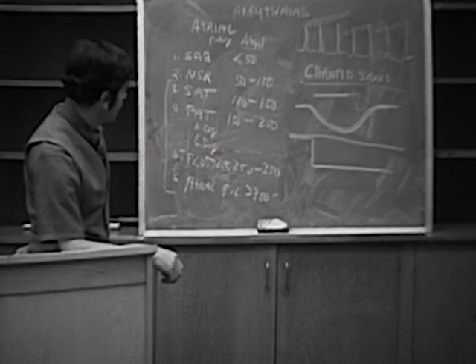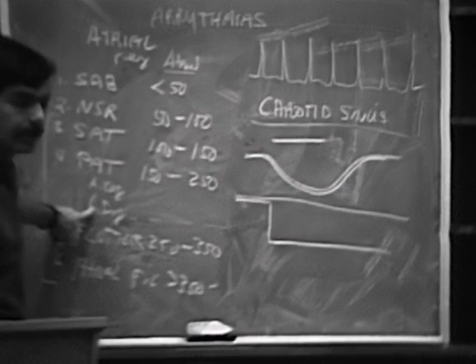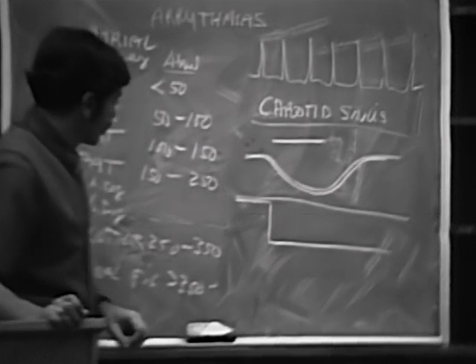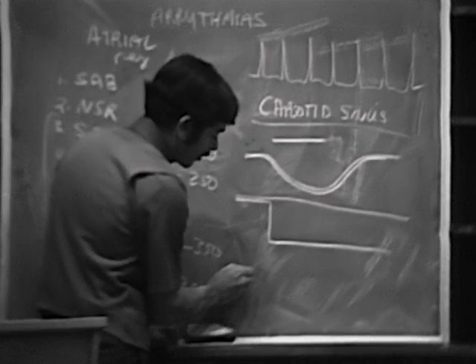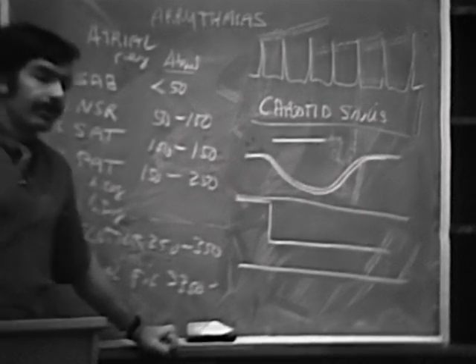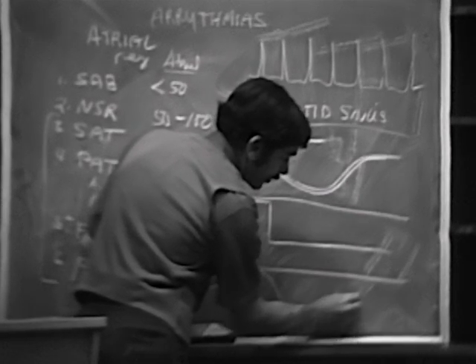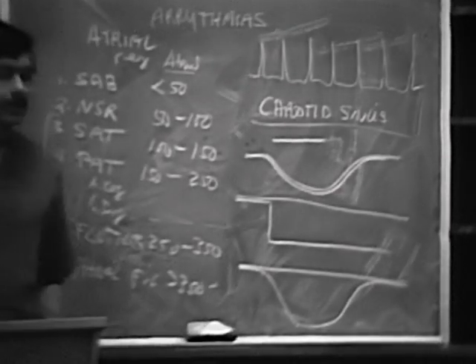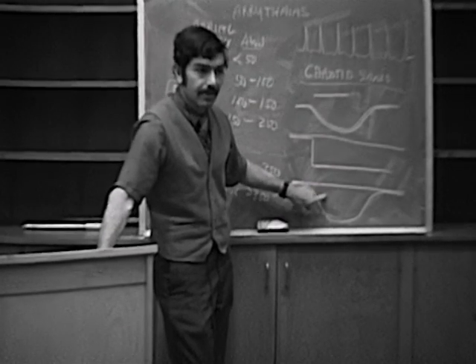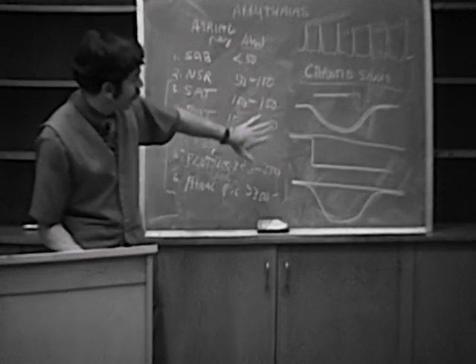Okay. Now how about the digitalis-induced PAT? What does that do? Well, you have a different response here. Your atrial rate remains the same. But when you press on the carotid sinus, your ventricular rate will transiently slow down and then speed up again. You have a gradual slowing of the ventricular rate. So what you've done here is you've induced AV block. Right? Your atrial rate remains the same. Your ventricular rate slows down. Okay, so do you see the difference here?